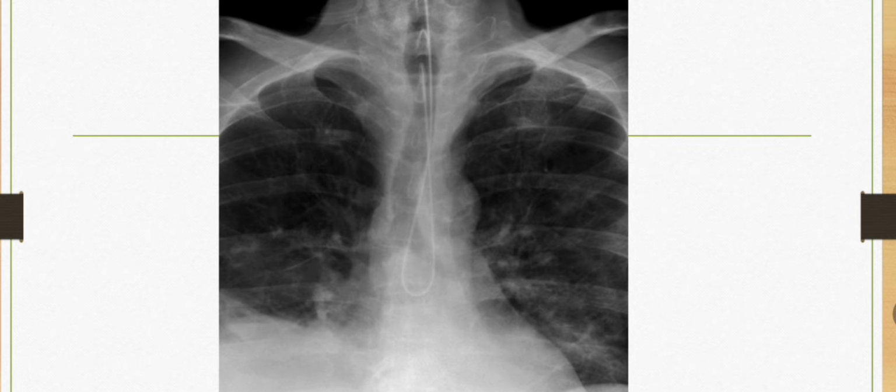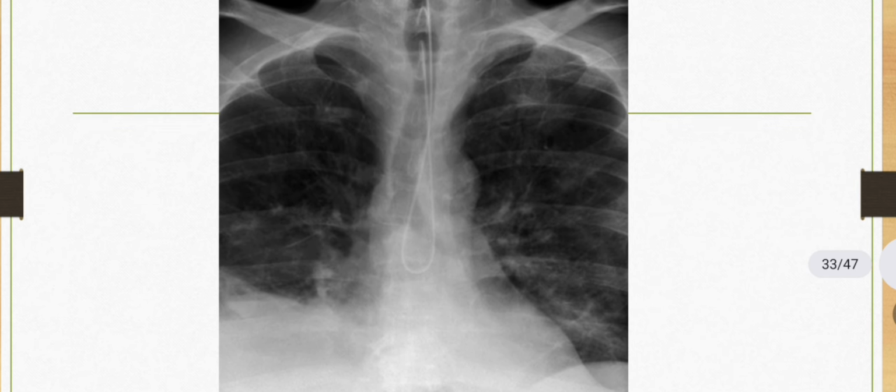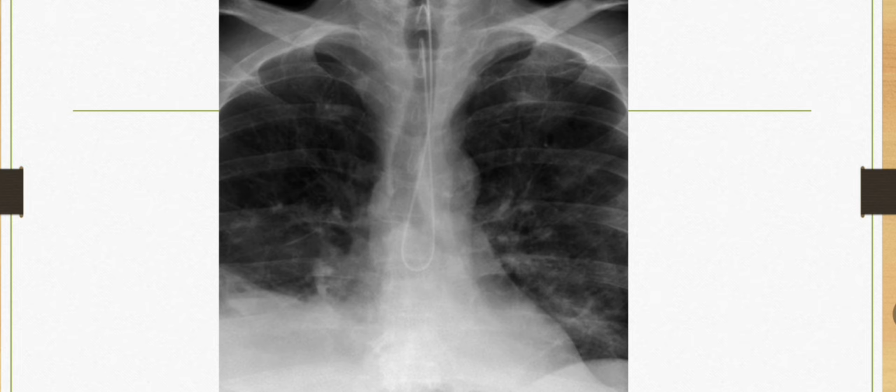Now comes C, the cardiac shadow. Now comes E, effusions. There is a mild effusion, but this X-ray is not completely showing it. Now look for fields. Now look for the devices. Here a device is placed, which is seen on the X-ray.